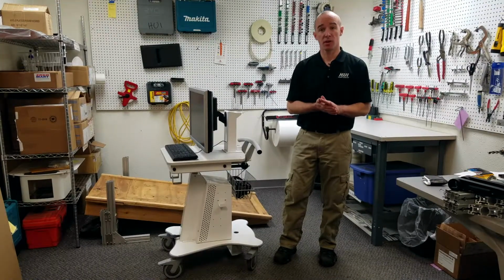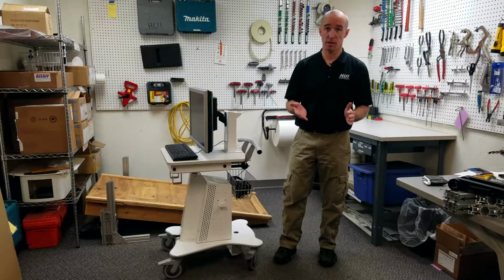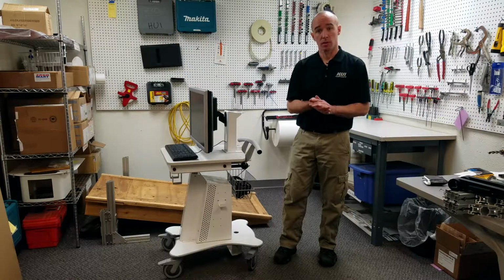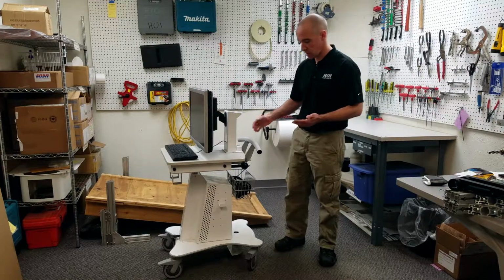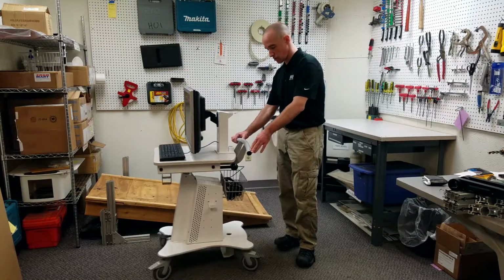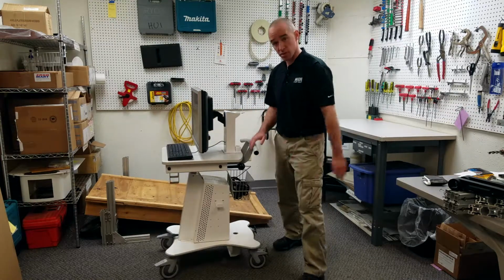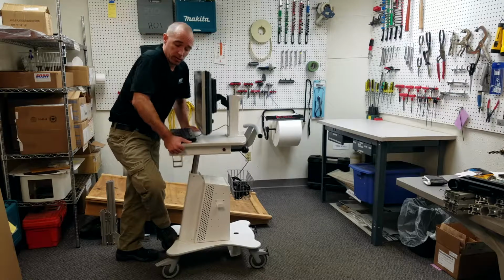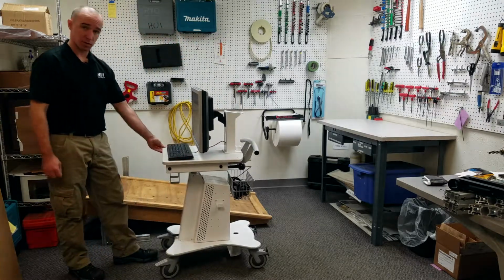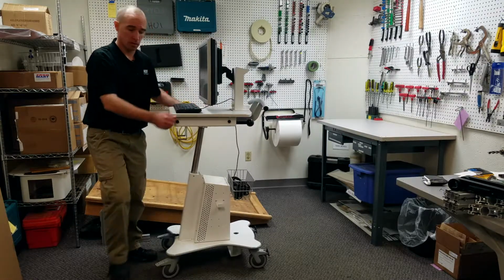So the difference between transport and non-transport mode is that non-transport mode is basically your least favorable condition or worst case scenario. For transport, you can go back to your information for use document and put the cart in the configuration for transport. For example, with a cart like this, it has directional locking wheels, so for transport you would probably have these called out to be in the locking position. This cart also has height adjustability, so for transport you will probably have it in the lowest position. And for non-transport, of course, worst case, we would have it as high as possible.